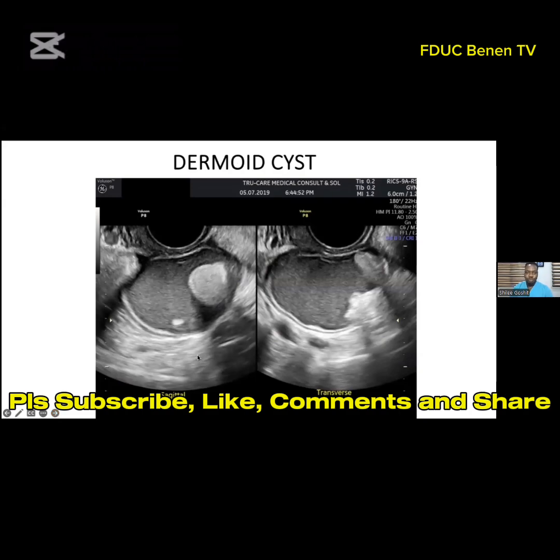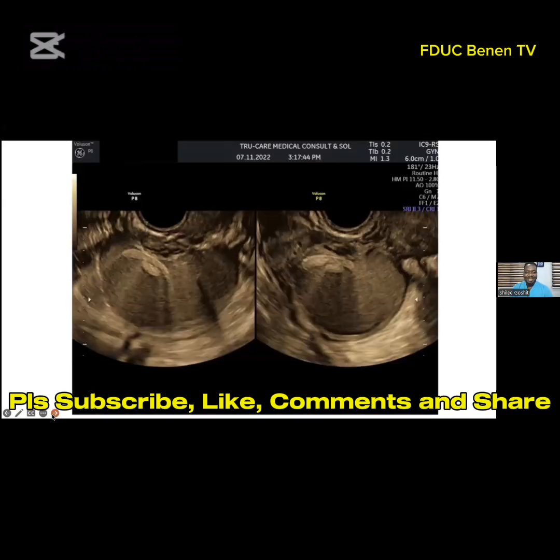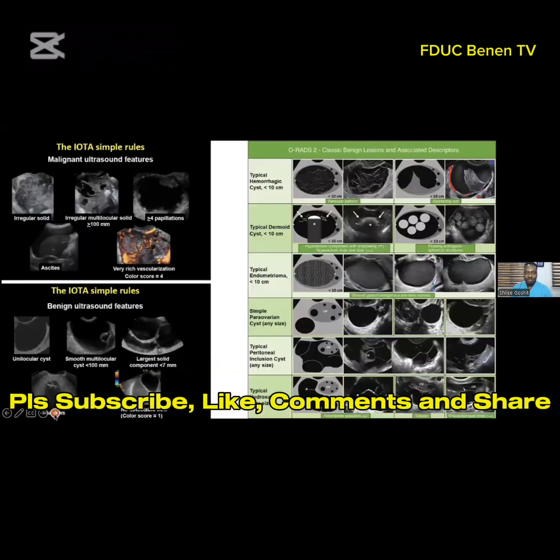Now, again, this is what looks like a dermoid cyst. With pattern recognition, we can easily identify this. Some call this the truffle sign, or like a paper that came out of Nigeria calling it the Akarabol sign. So again, we may have different pictures of this.